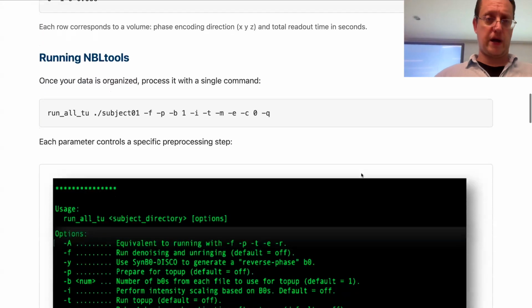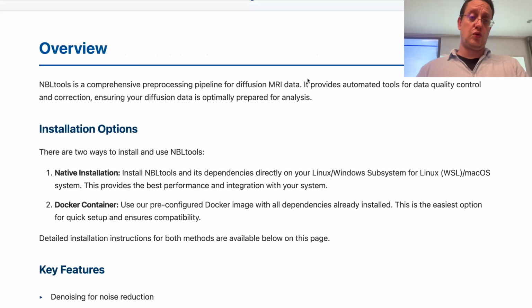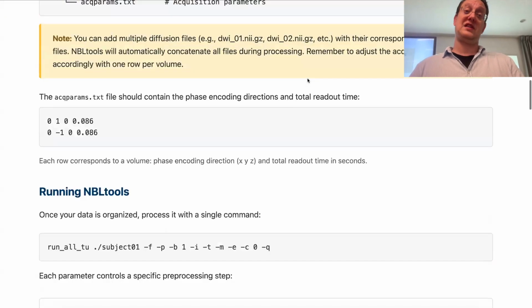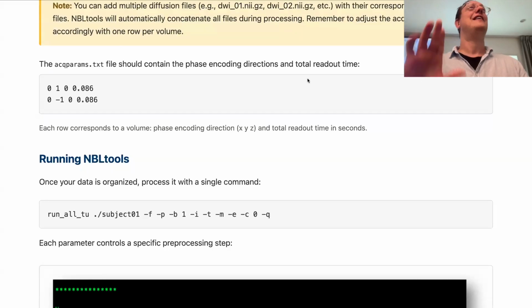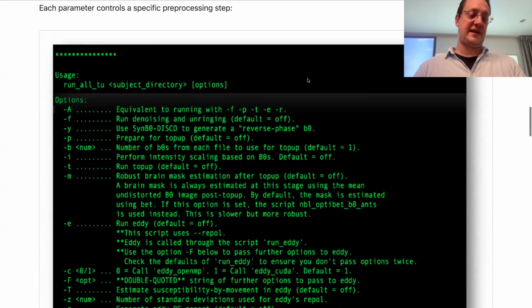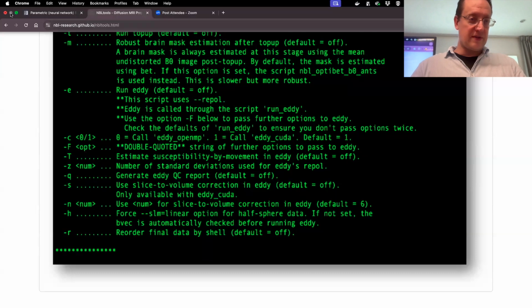Okay? Right. So this was to give you more information about how to set up the preprocessing. We've been working with this a long time, and everyone was asking us to do the preprocessing. Now you can do it by yourself. It's working. We crashed it many times, and now I think it's quite stable. Right. So this was one thing I wanted to talk about.